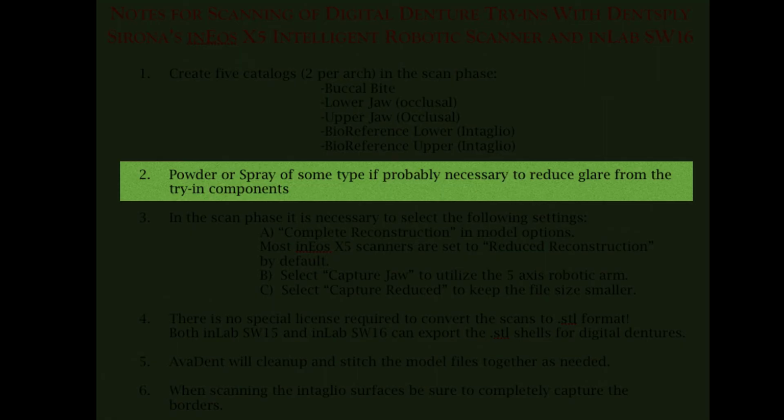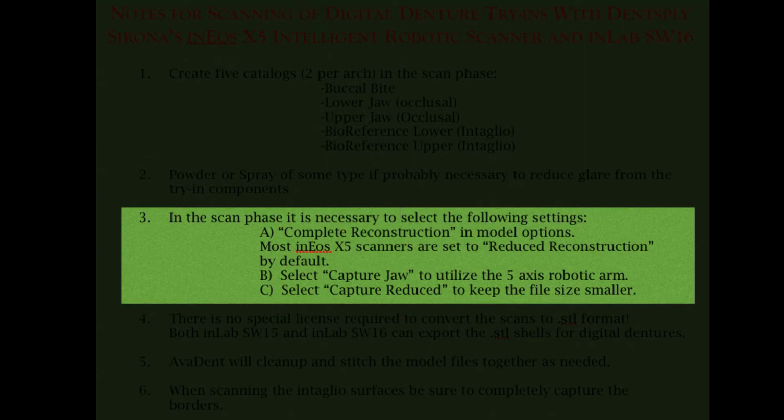2. You're probably going to need to use some kind of powder or spray to knock down the glare, and anything that might be translucent needs to be covered up.